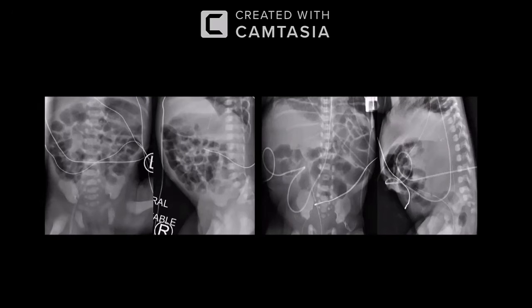So I'm thinking that this is a case of distal intestinal obstruction. There is no free air, so it's a case of distal intestinal obstruction. My differentials would include meconium ileus or Hirschsprung disease. I would convey my findings to the referring doctor, and this patient needs a surgical referral and evaluation with barium studies.